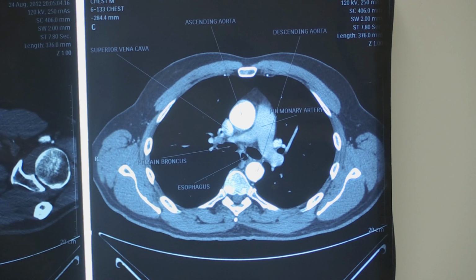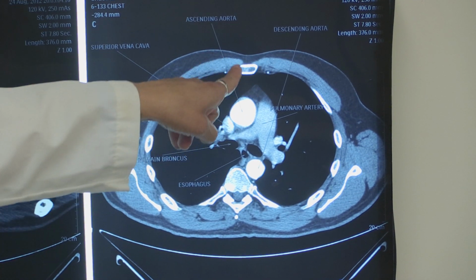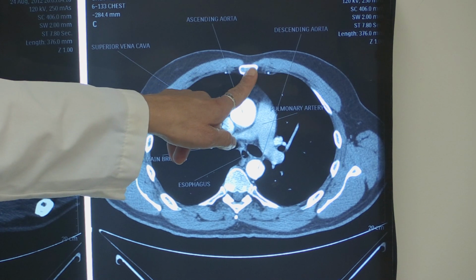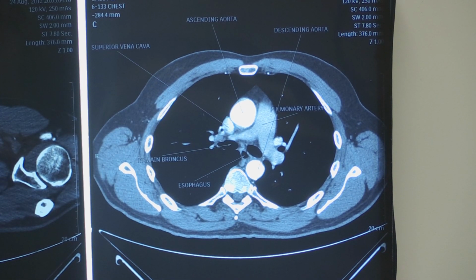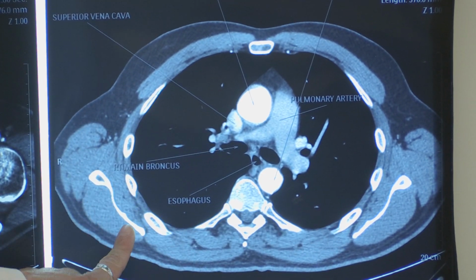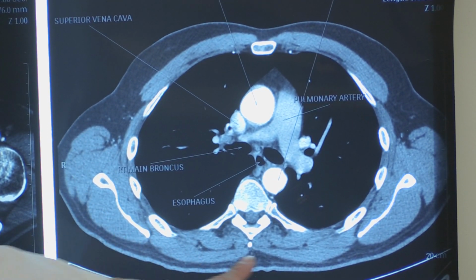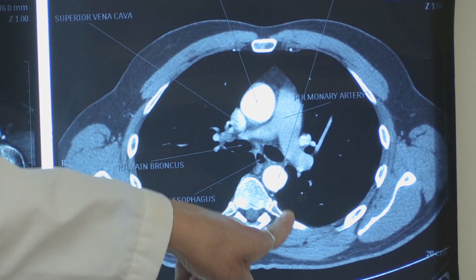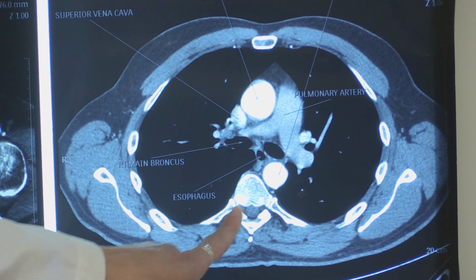Now we don't see the sternal manubrium. Now we see more of the end of the body of the sternum, but we can still see some ribs, the scapula, muscles, thoracic spine. And remember, the thoracic spine is always going to have ribs attached to it.